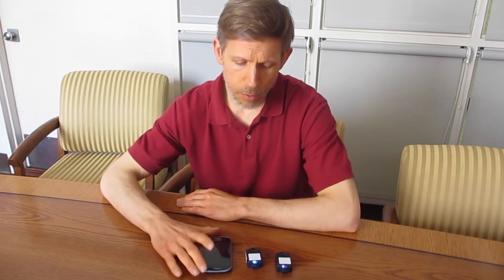In order to collect data from a patient, obviously we have to use these kits. There's a problem that we have in that more than one person can use the same set of sensors. More than one person can use the same kit. Presumably, throughout the course of your participation in the study, you will be collecting data from more than one participant, but you'll have to use the same kit over and over again several times.